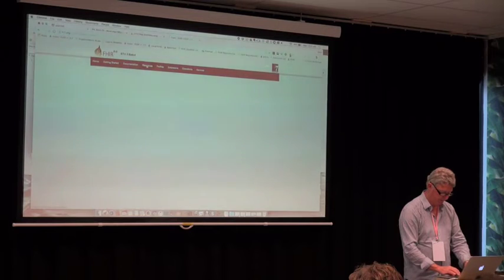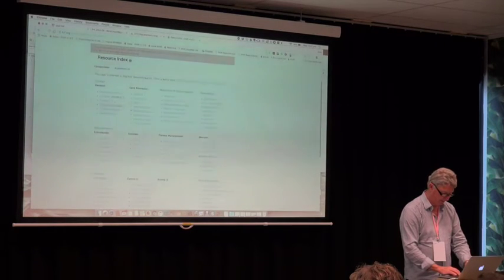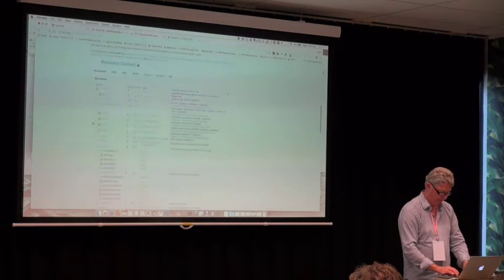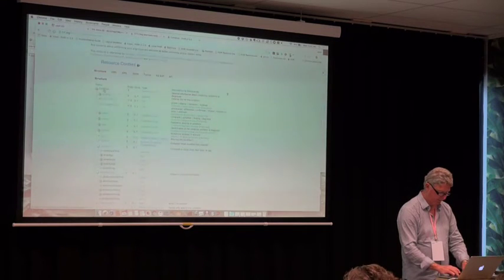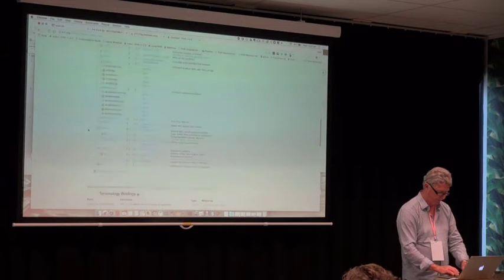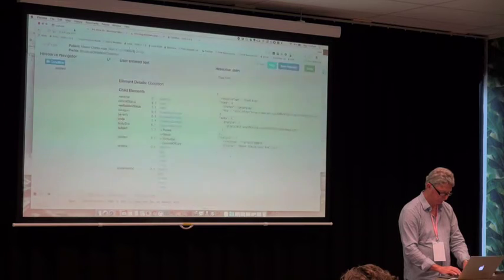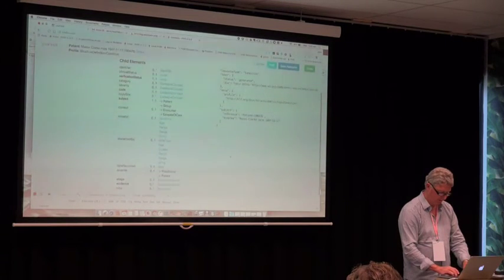Let's go into resources and find condition. In effect, since I've selected condition, it's viewing in that center list all these ones that were in the middle, as opposed to stage and evidence. If we go back into clinFHIR, we see all of those down through there, and there's stage and evidence.